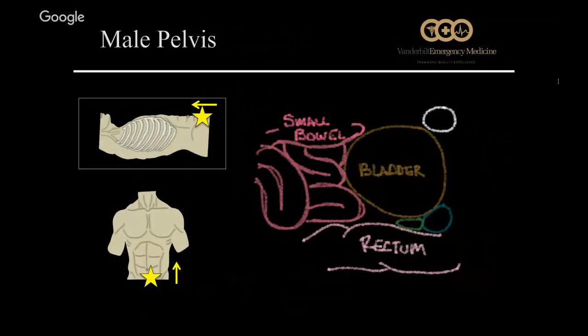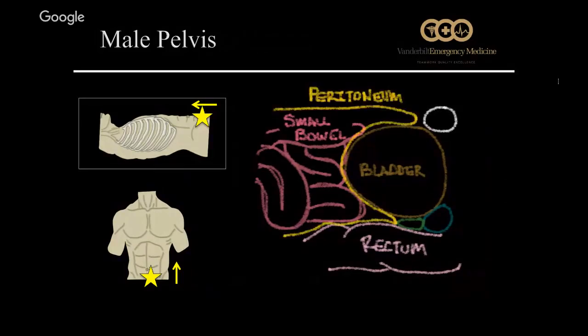Great. One more time. So in yellow, we've outlined the peritoneal cavity. You can see that it traces along the rectum and then ends at the seminal vesicles, which are the green area, and then angles up along the bladder and then around the abdominal cavity. There we have the prostate and seminal vesicles labeled for you.